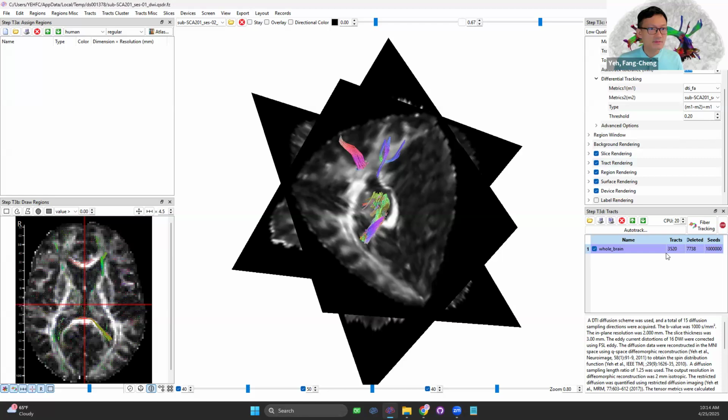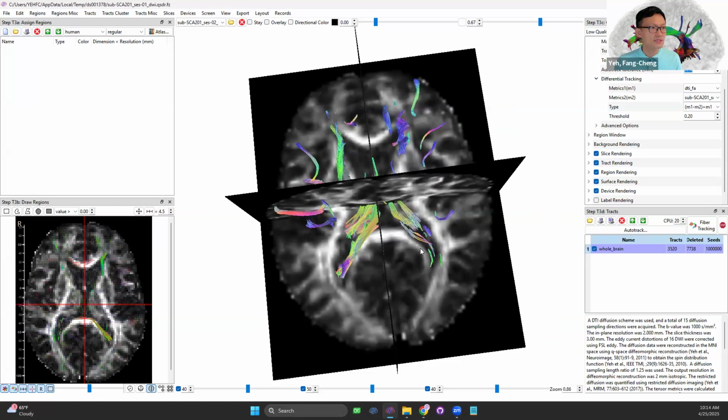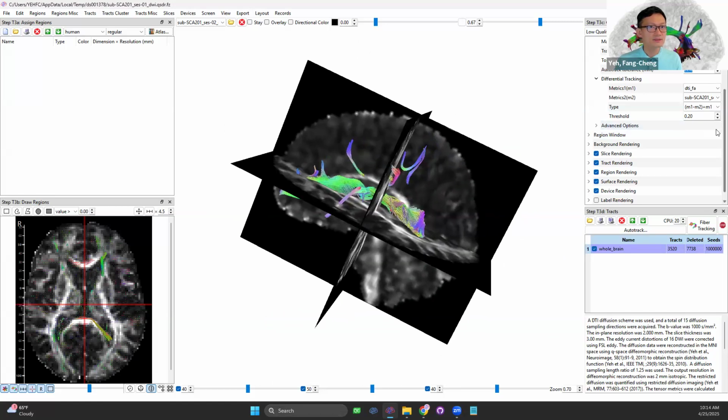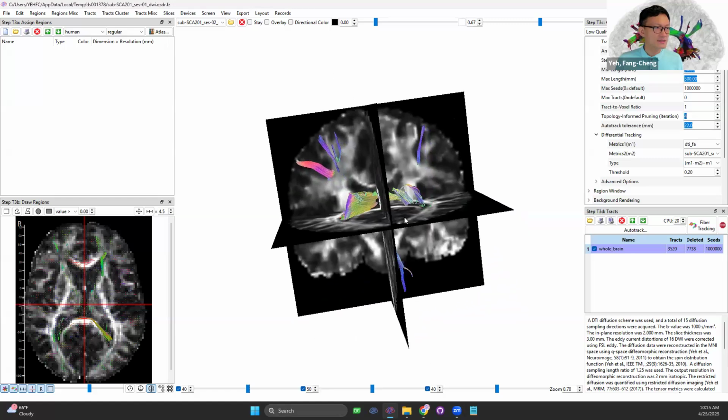And you can immediately hit fiber tracking, and it starts to get some results showing the decrease of the tracks in this patient. We haven't changed a lot of parameters here, but you can double check. Usually we will have a fixed seeding count. If you're using an older version, then you would need to switch to terminate if and set the seeds as the termination count number here. Usually we will put like 1 million seeds, 2 million or 5 million, depending on how much you want to get. And those are the results here.